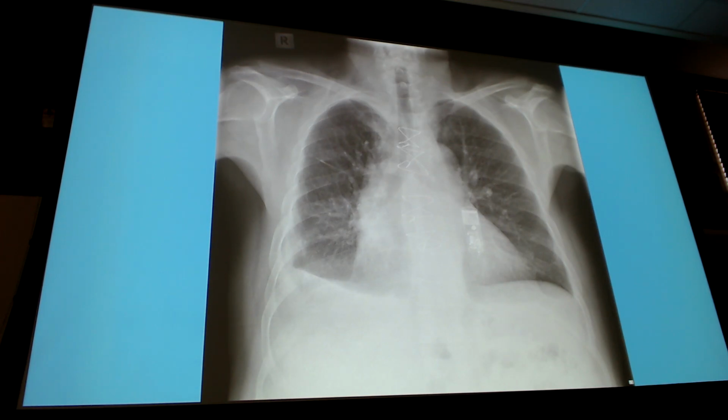Right there. Everybody see that? Small little parabronchial cuffing. Nice dark circle surrounded by a grayish fluid area. So good eye.